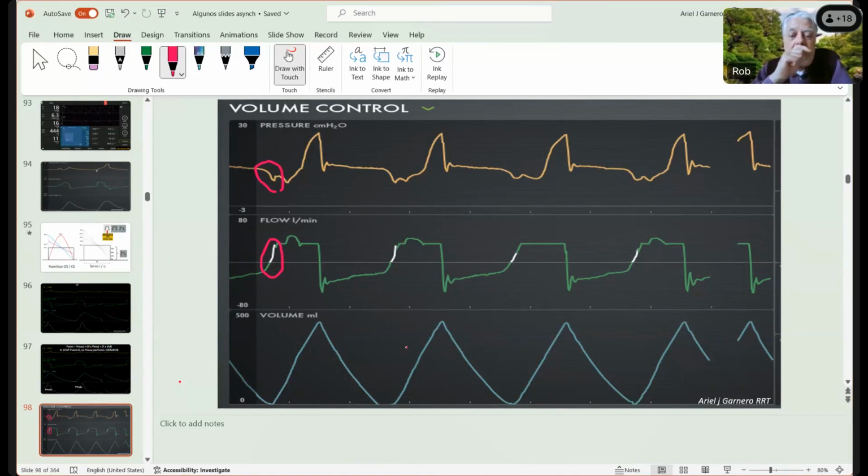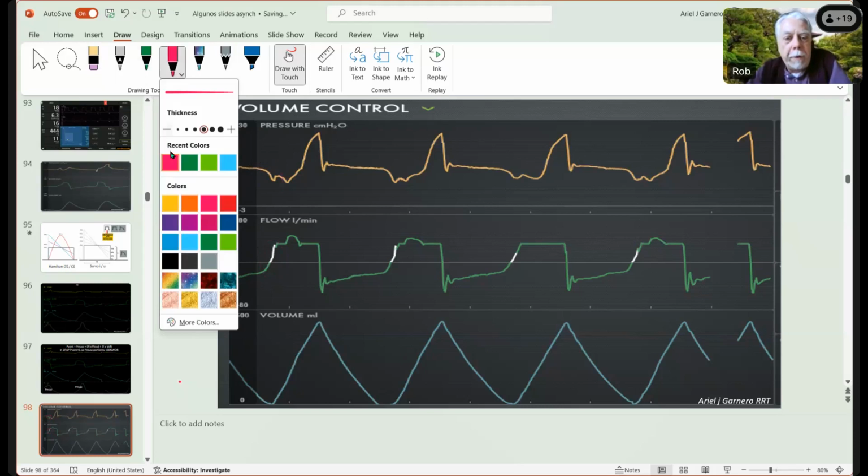So now let's take a look at the load. Lots of stuff going on here with the load. As we already pointed out, there's a P muscle during inspiration, so we could call that a little bit of work shifting, not severe. Anything else that we see here about the load? Looking specifically at the expiratory flow waveform, what do you see happening there?